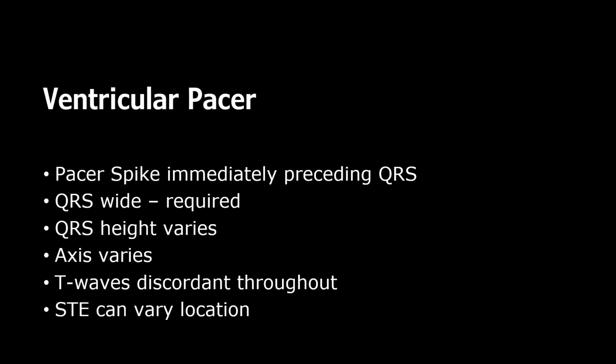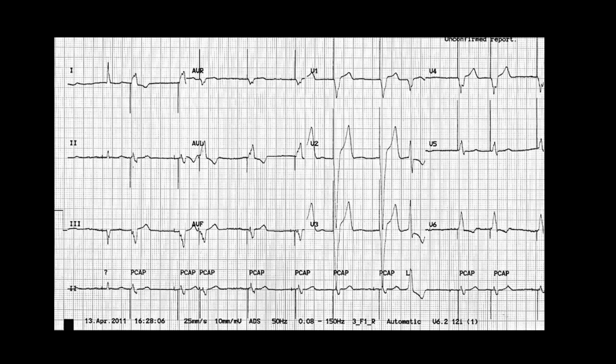So if you have an atrial pacer rhythm with ST elevation, then that patient's most likely having an acute MI, especially with a clinical presentation to boot. So we look here, we've got a standard ventricular pacer. I've got some ST elevation in V1, V2, V3. You guys are hopefully catching the drift here. QRS is down, T wave's up, ST segment's going with it, not more than 25% of the depth of the QRS. I'm not worried about it. I'm moving on. That's just a normal pacer.